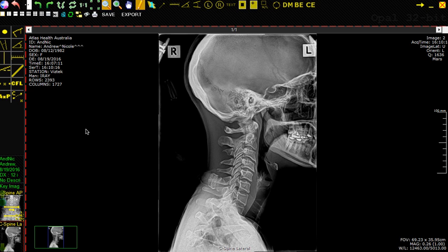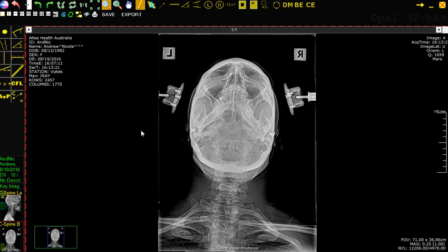I am a Blair chiropractor, and I'm just going to be going through a little video here today on some of the annotations that we use, but also some of the annotations that ideally we would love to have as far as analysis. So I'm just going to walk through a couple of the pictures here, and truth be told, the one that I think we're all the very most interested in and that we need the best tools in order to work with is an X-ray that looks like this.